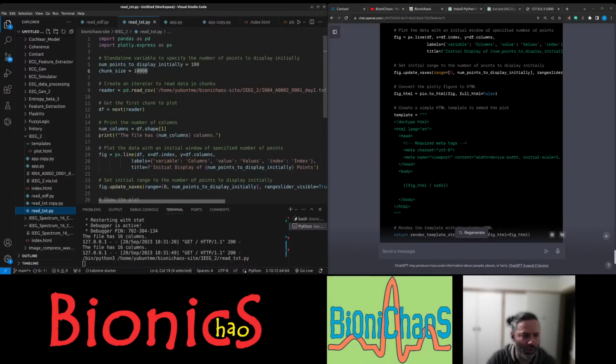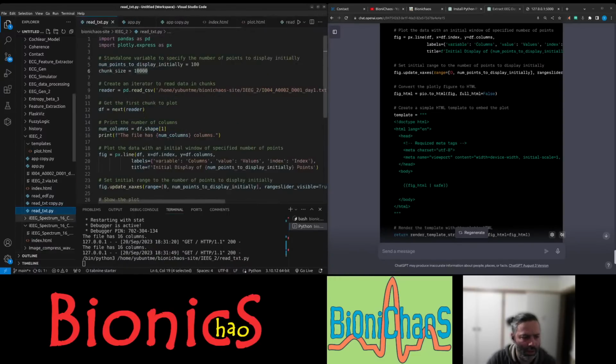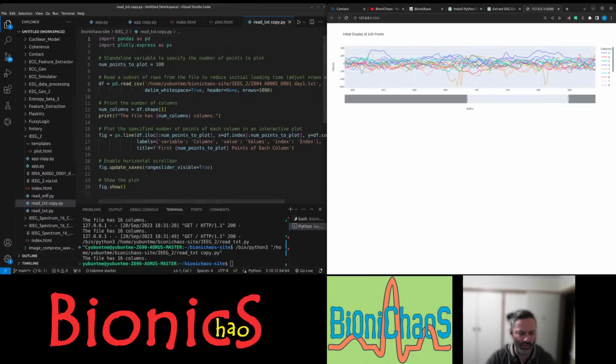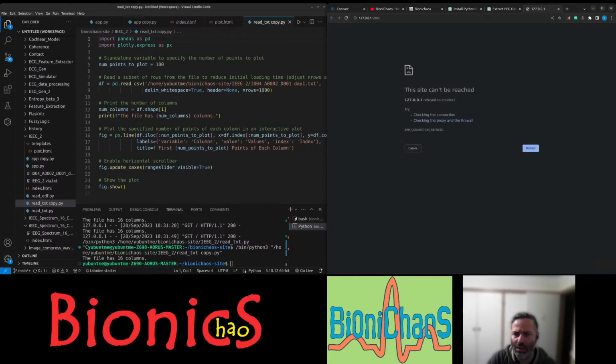Oh, no. This is the one loading the whole file. Abort. Right, okay, now I'm confused. Doesn't matter, we don't need that anymore. We have this one. And that stopped working, of course.